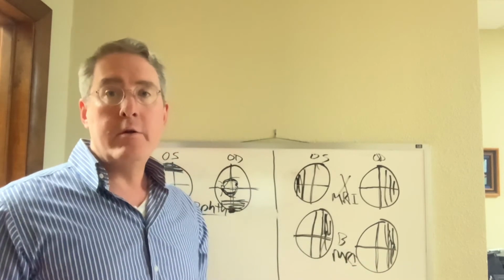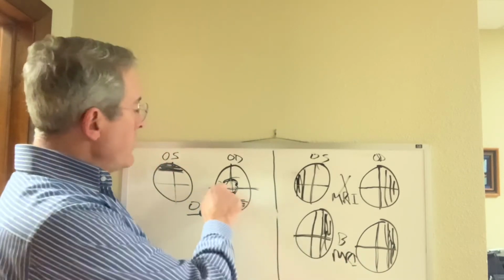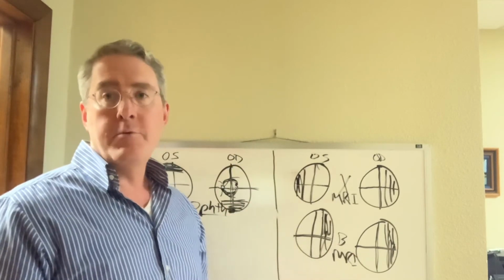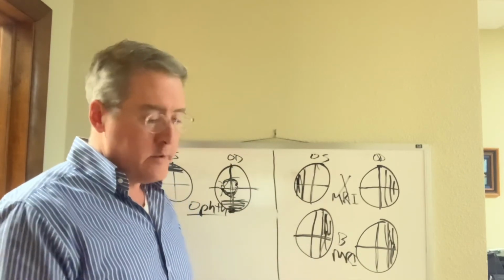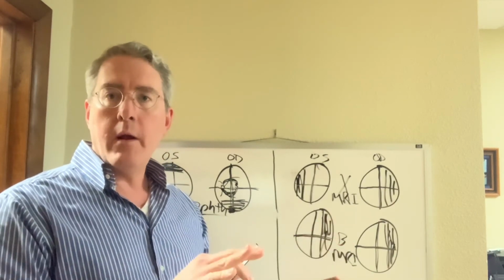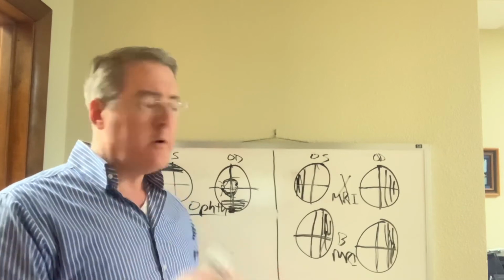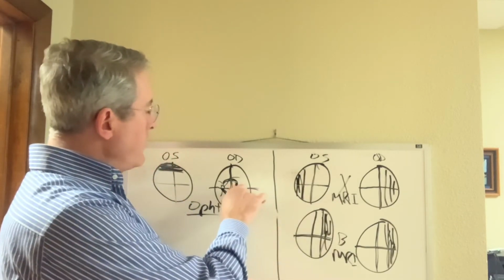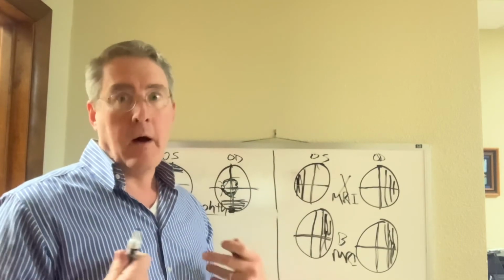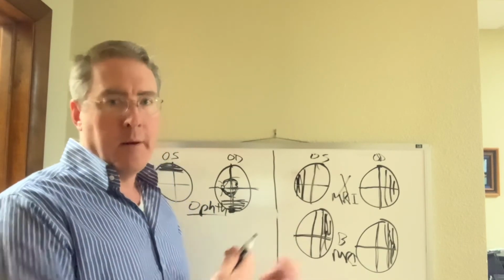So there's really only two decisions that you have to make. If it respects the horizontal midline but crosses the vertical midline, those people see an ophthalmologist. The gentleman that I showed the visual field from earlier, it was only in one eye, and it was cecocentral, and it actually was respecting the horizontal midline. He obviously saw me because that was the appropriate thing.